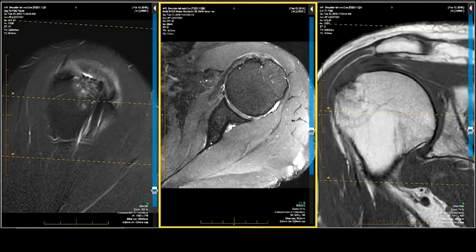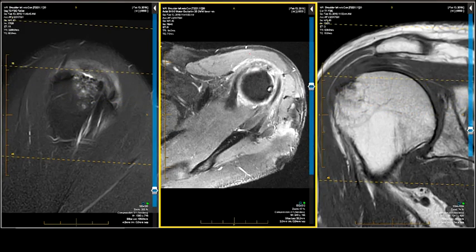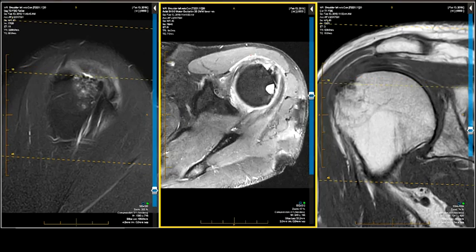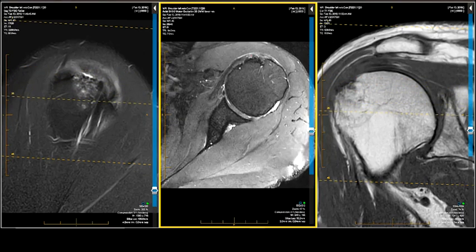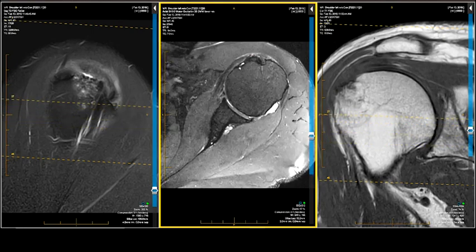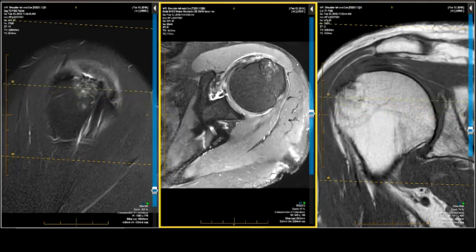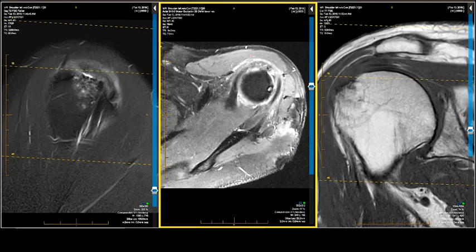Should you comment on the glenohumeral ligament complexes? Of course, in the proper setting. Do I routinely comment on the superior, middle, and inferior glenohumeral ligaments in a regular standard shoulder report in a non-dislocator without macro instability? No, I don't. I'll say the capsule is normal, so I don't specifically call those out. Now, in SLAP lesions and dislocations, I absolutely will call them out one by one.